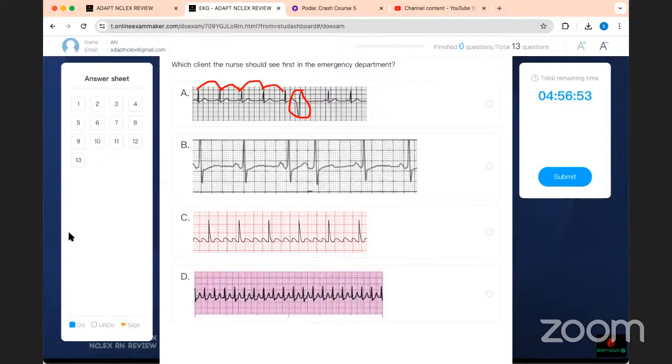It looks like a ventricular rhythm. He has no atrial effect. These are atrial and ventricle. So this is different. It's abnormal. It just fires abnormally without following the pattern, and then everything picks up again. This is what we call PVC. So this is a PVC.